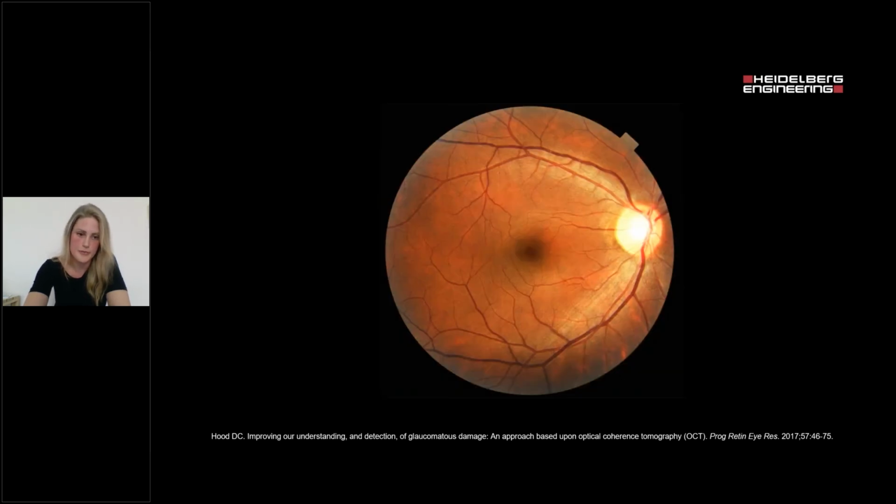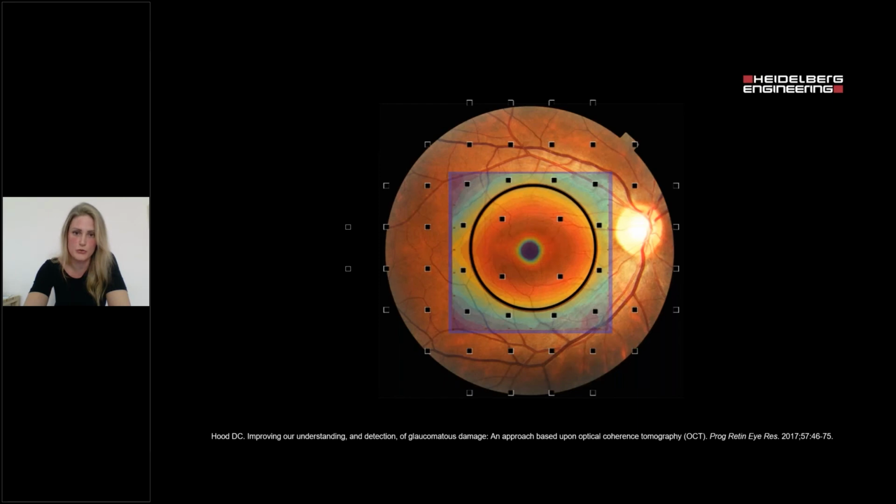So again, the fundus view with the 24-2 points superposed shows that almost no points test areas of common damage and cannot predict a structure-function relationship, while a great number of the 10-2 points in the macula improves the prediction of the structure-function relationship in those defects centered primarily in the macular vulnerability zone.